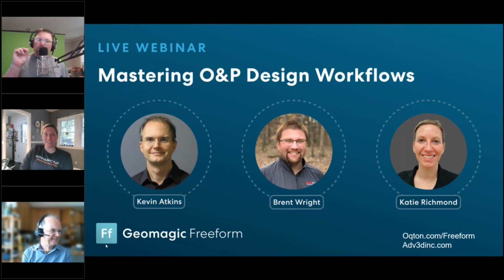They're just like any other device. That haptic device has a higher resolution. So if I'm doing facial reconstruction and I need pixel control, this would probably not be the right device. And we're not talking about that for the prosthetic and orthotic field. Plus, most clinicians, business owners, are cost conscious.